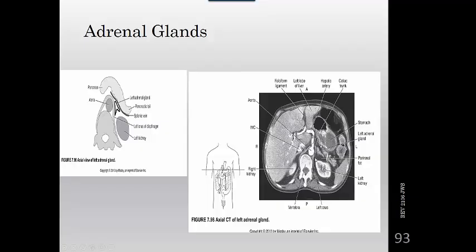So if you look on the CT scan, you see there it is, the tissue that's that inverted Y, inverted V shape, or the triangular shape of that left adrenal gland here if you follow my cursor. And then here's the perirenal fat that's separating it from the actual parenchyma of the kidney. Here's the crus of the diaphragm, it's kind of running right through here like this, and aorta, of course, and then the left kidney. Pancreas is coming through here like that.